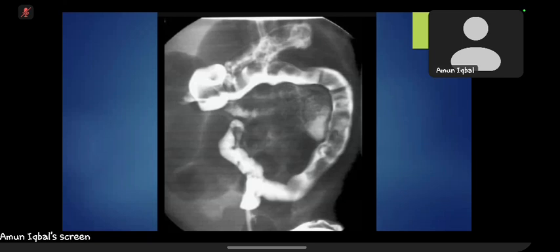Okay, the next point is what kind of management you would advise for the baby who underwent the barium enema study and passed the stool on the table. So what will you tell the primary physician? How will you convey this to the primary physician? In this case or in meconium ileus? You can tell about this case also. In this case also, the baby passed the stool on the table. I think both of them are relieved interventionally due to contrast. Yes, exactly. So be confident about it.